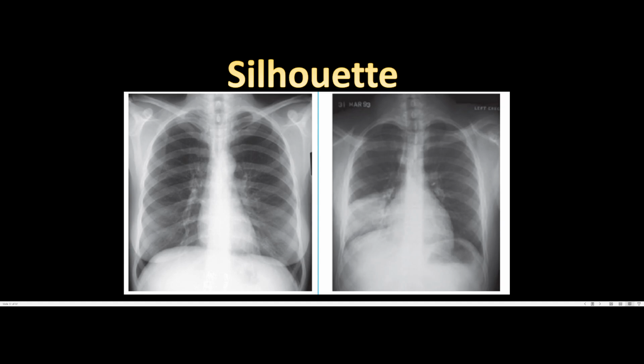So in our episode number 5, we'll be reviewing some of the cases related to chest imaging, specifically on chest X-ray. And especially those in internal medicine and even those in surgery, but mostly in internal medicine. So there are obviously a couple of cases here that I got from a PowerPoint slide in my curriculum in regards to internal medicine, and we'll look at them one by one.